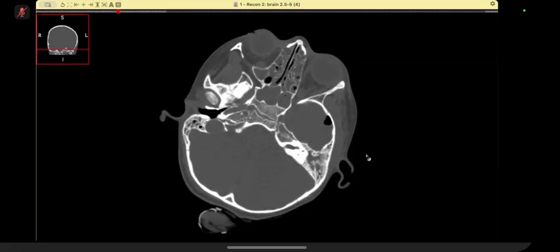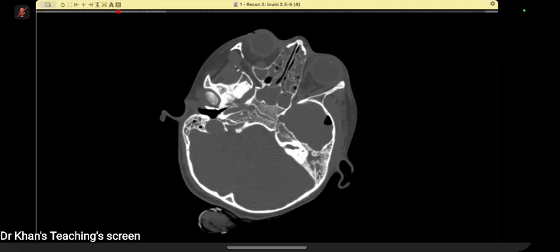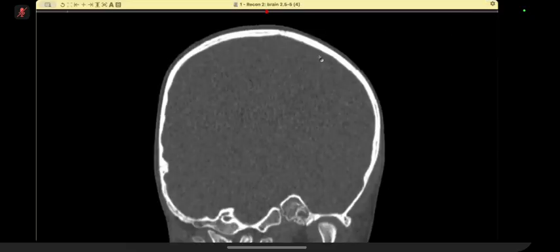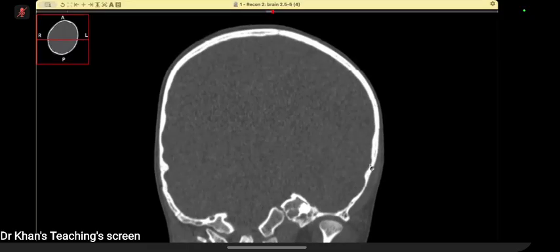I need to see if there is a coronal study, coronal imaging, to assess the tegmen tympani and the tegmen mastoideum, and if there is a contrast study, to assess the deep venous system and the sinus. Just one second, please. I've given you coronal. Okay.